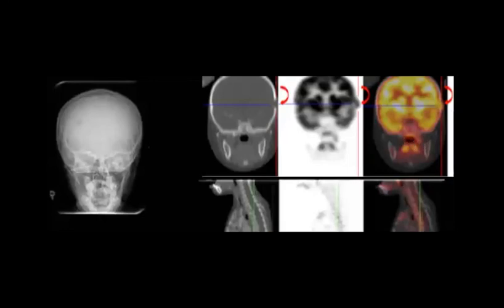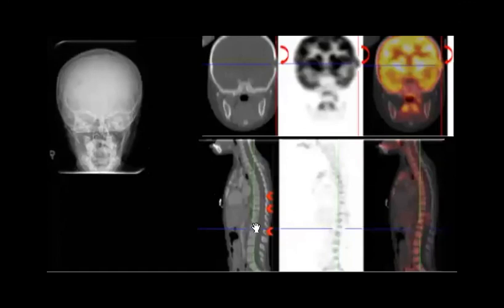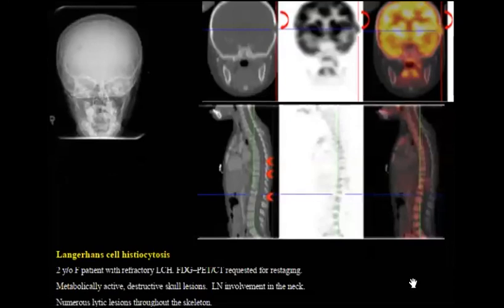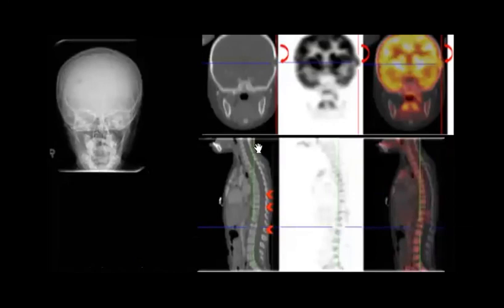Very nice differential, especially if you find what is called vertebra plana. Yes, you can see that there are multiple levels of EG, vertebra plana. Perfect, Ala. So with vertebra plana, mention EG as one of the good differentials. You can put it as one of the best differentials. Okay? Langerhans cell histiocytosis, lytic lesions, go with your normal approach. Hiba, revise because this patient is very young. Okay? So metastasis, okay. EG, okay.